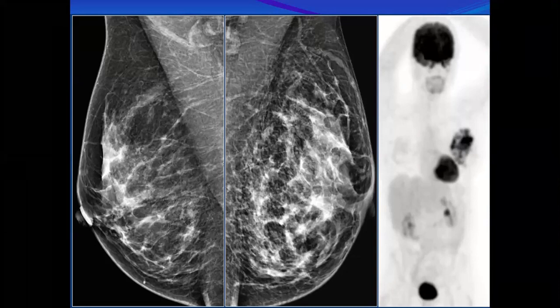The enlarged one. Okay. Why did you confidently say the enlarged one? This means it's not a normal variant. There is additional pathology. And if the global asymmetry is smaller compared to the other one, it will be a variant. Why is it small?